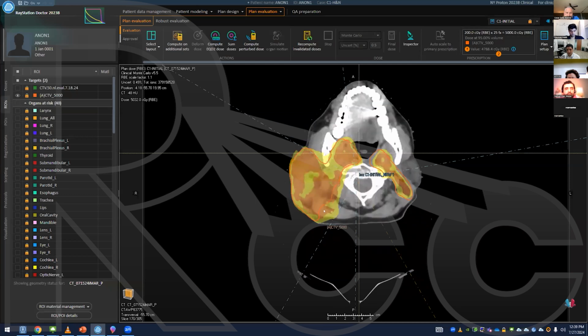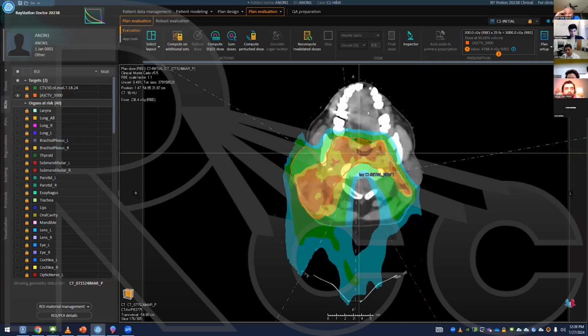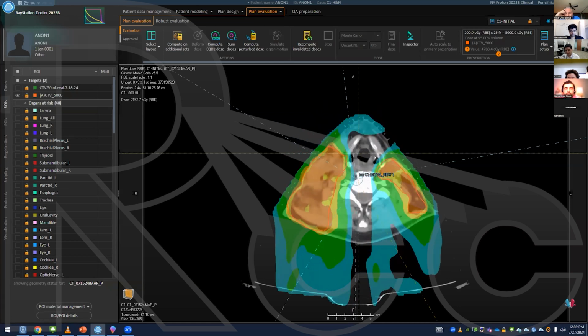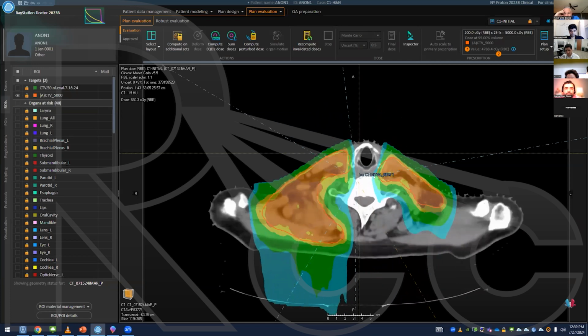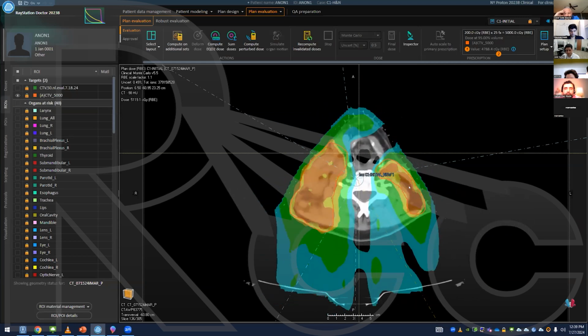And then another difference is if you look at the lower isodose lines, so 25 gray here is 50% of our prescription, 50 for the first phase. You see the nice sparing of the oral cavity that proton allows. In Dr. Malik's plan, it was bowing out a little more at the 50%, frying those taste buds, but with proton, it's pretty conformal. And then also down here, you see that the midline sparing is quite excellent. So as you get lower down, the esophagus really isn't getting much of any of this 50%. So that's really good, and it's harder to achieve that with IMRT.